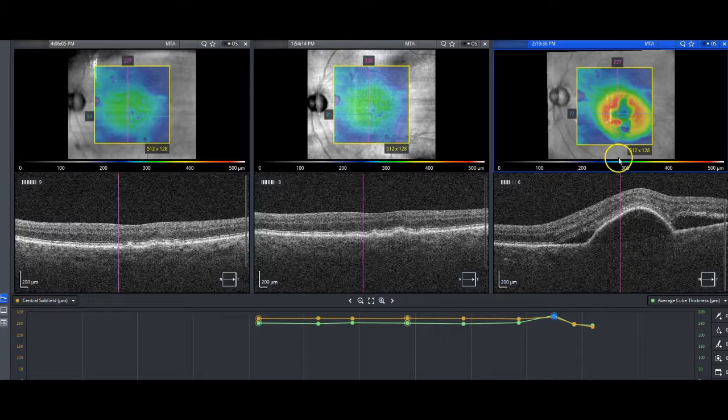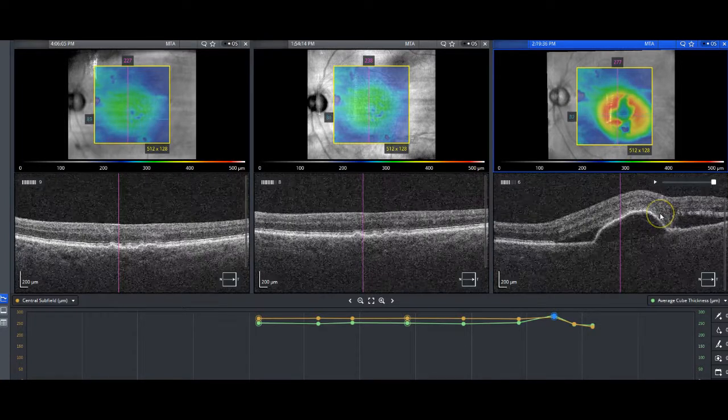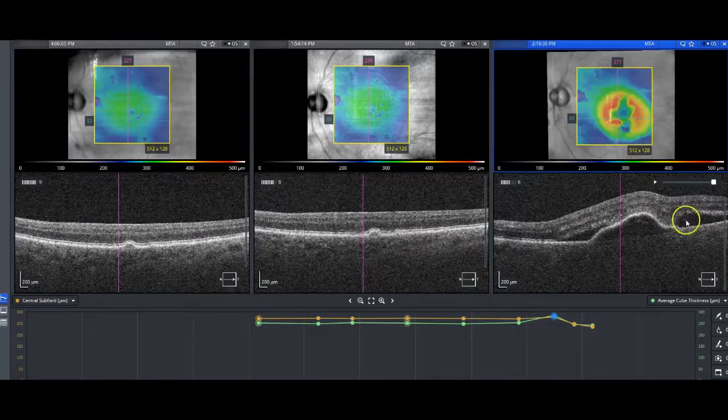And the patient comes back, and you can see they're substantially worse. Definitive subretinal hyperreflective material now is noted, as well as significant amounts of subretinal fluid and an ever-increasing pigment epithelial detachment. All of that is to say that you want to look for the company that things keep, meaning if you've got subretinal hyperreflective material, intraretinal fluid, subretinal fluid with a PED, you need to be suspicious that you're actually looking at a lesion that's choroidal neovascularization.